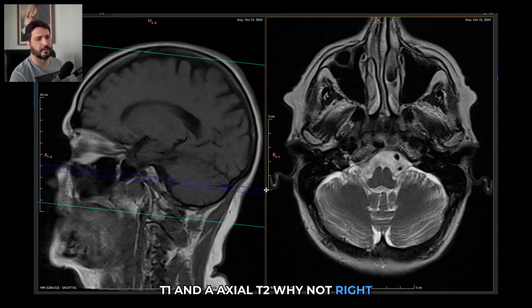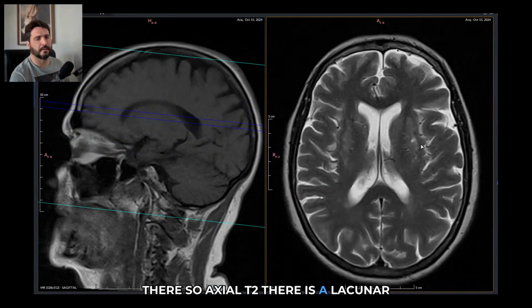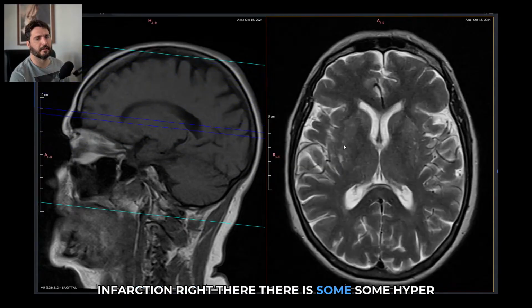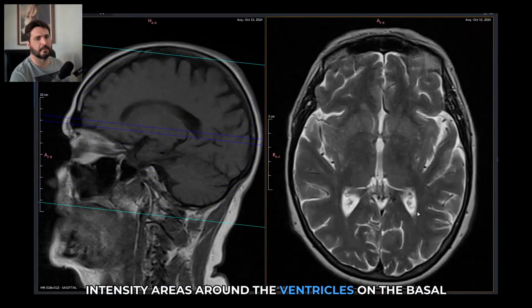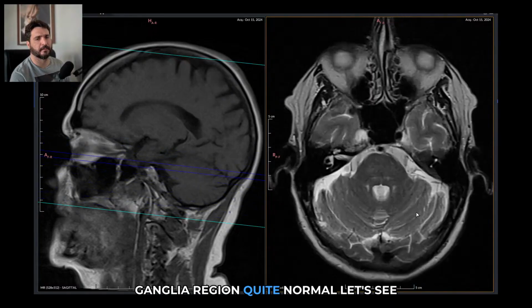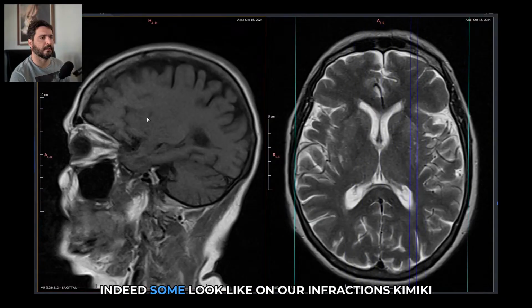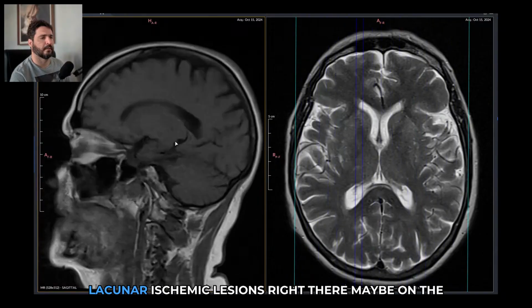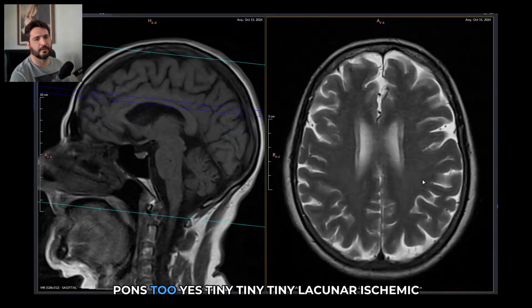Why not? Right there. So axial T2, there is a lacunar infarction right there. There are some hyperintensity areas around the ventricles on the basal ganglia region. Quite normal. Let's see. Indeed, some lacunar infarctions, lacunar ischemic lesions right there. Maybe on the pons too.